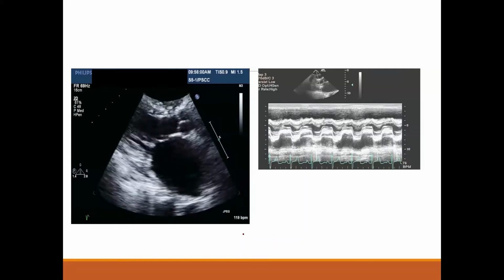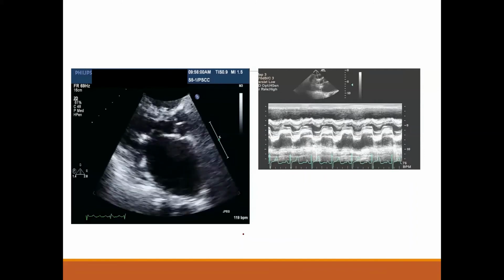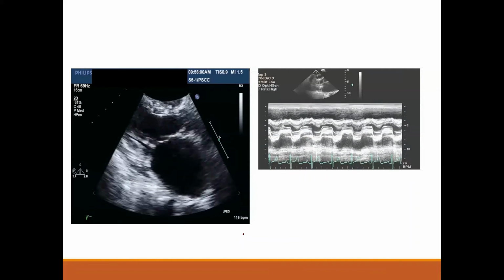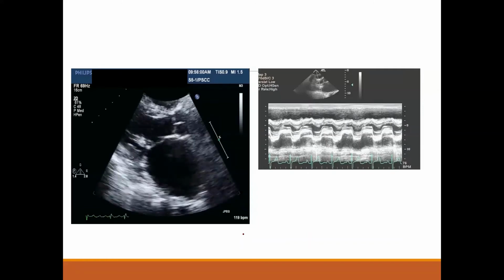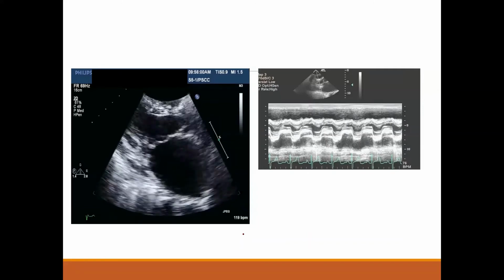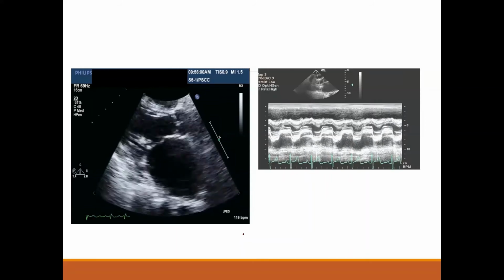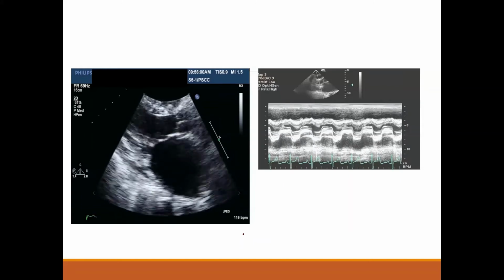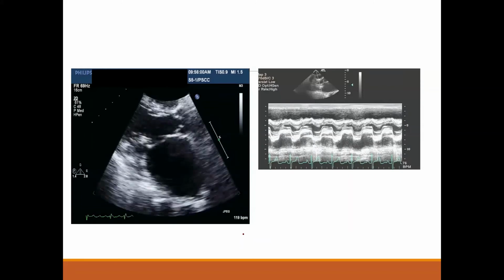Parasternal long axis view. Okay. Dilated left atrium. Okay, very good. It's mitral stenosis. Very good. Mitral stenosis, but I'm missing one thing you have to describe before mitral stenosis: the morphology of the mitral valve itself, which is rheumatic, yes. So okay, rheumatic mitral valve with mitral stenosis.